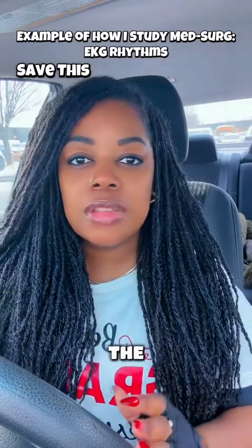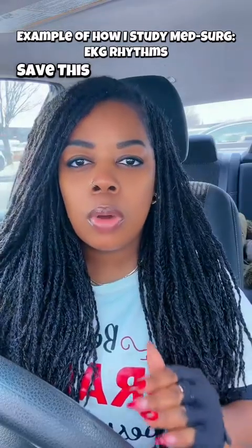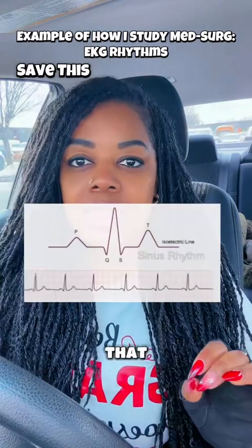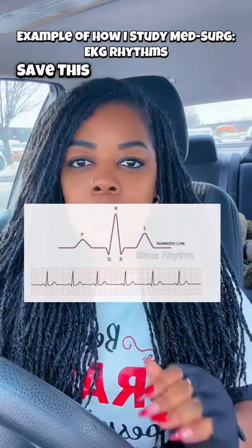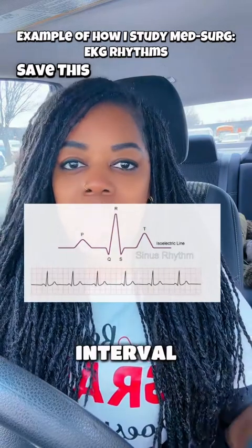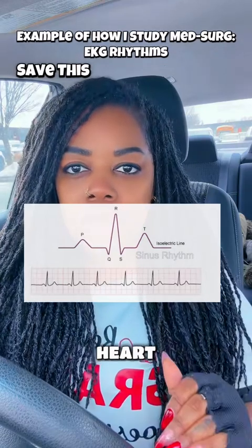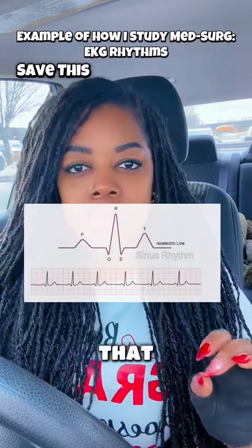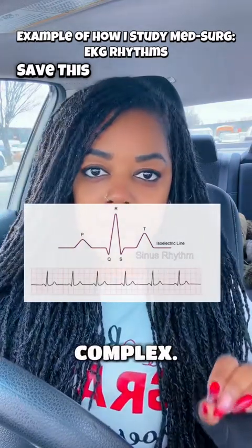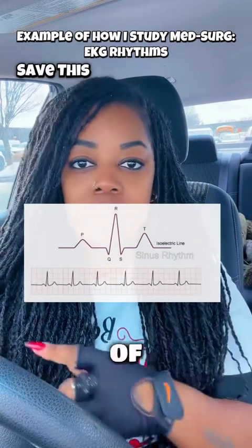First things first is the foundation. Okay, you have to know the why. You have to know what a normal heart looks like at the electrical level. In normal sinus rhythm, that first little bump is the P wave. That's your atria contracting. The PR interval is just the electrical signal's commute time from the top of the heart to the bottom. And that big spike, that's the QRS complex. That's the big squeeze where the ventricles pump blood out to the rest of the body.